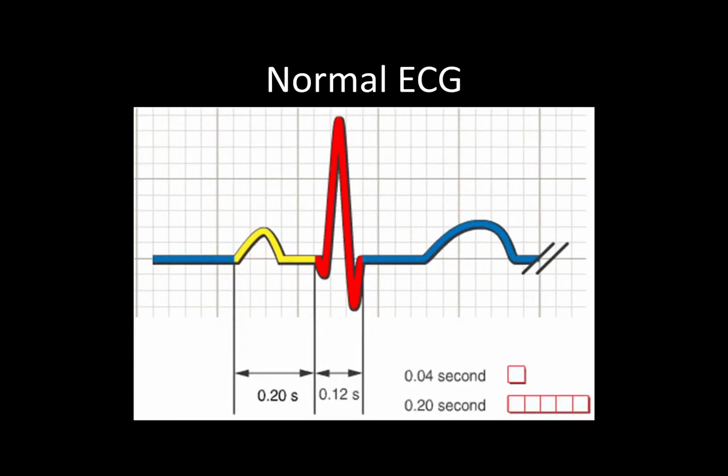Okay, so this is a basic standard EKG complex as seen from lead 2. So what we start out with is our isoelectric line.